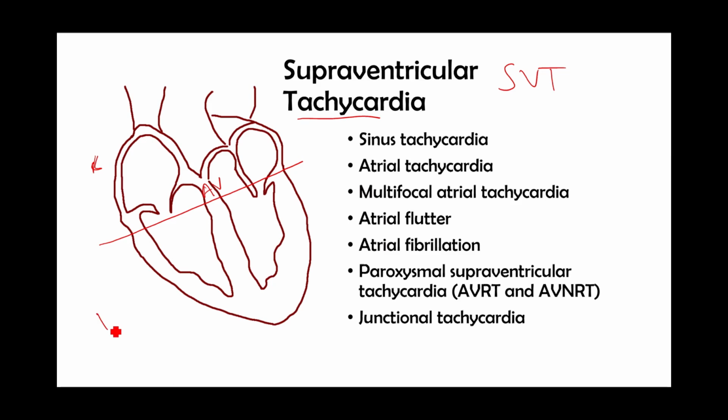If you recall, depolarizations originating from the ventricles, such as VTach or VFib, or even idioventricular rhythms, tend to have a wide complex due to dyssynchrony in left and right ventricular depolarization. Depolarizations of the ventricle that start from above the ventricles, such as an SA node conduction or an AV node or junctional conduction, tend to be narrow complexes. So in general, SVTs tend to be narrow complex tachycardias.